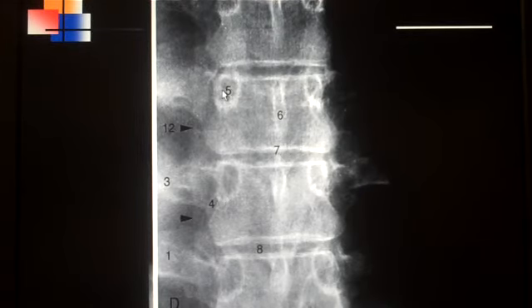The more elongated or elliptical looking pedicle is the side of spinous, and the wider or fatter looking one is the side of body. Number 6 is the spinous process, and this spinous process is the spinous process to this segment. You can just barely see the edge of the lamina right here and the edge of the lamina right there. Lamina in this area is very flat, so it's going to be not very distinguishable as far as being able to see the density of that.